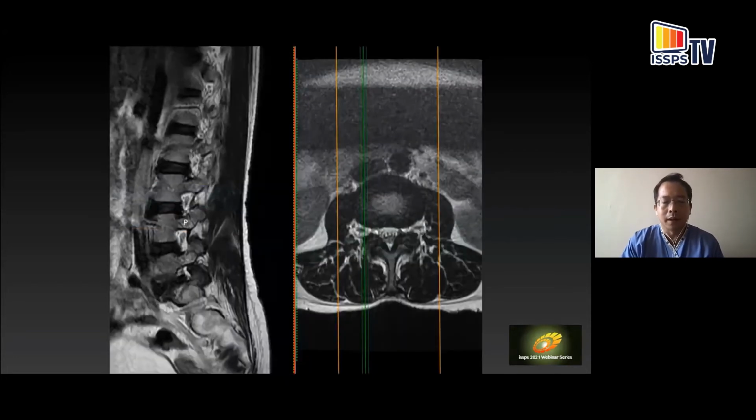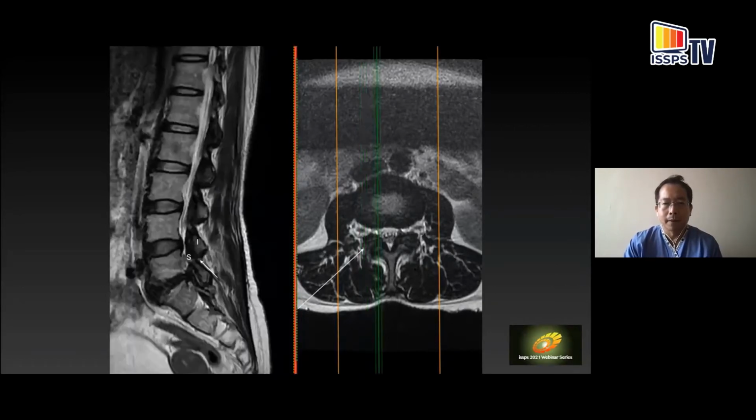Now, the sagittal anatomy is also important for us to go through before we perform any of these injections. You want to identify the pedicles first. Remember how the pedicles are attached to the vertebral bodies on the superior half, leaving a large notch down here for the nerve root to emerge. And we're now at the level of the lamina itself, and you can see the inferior articular process and the superior articular process of the facet joints forming a facet joint over here.